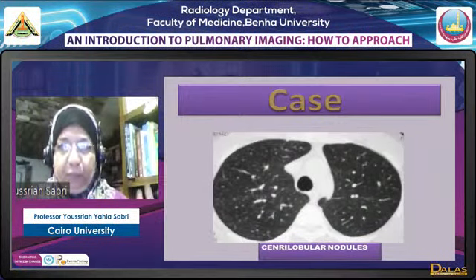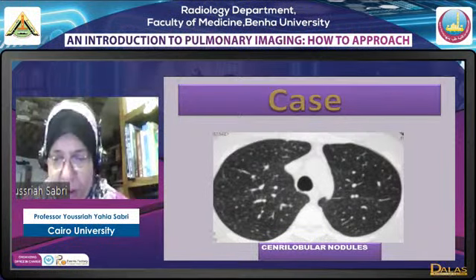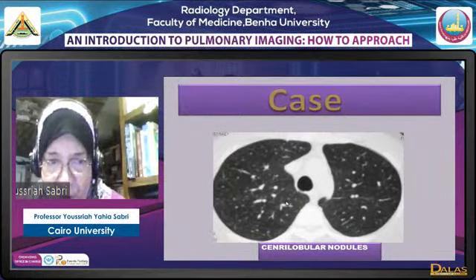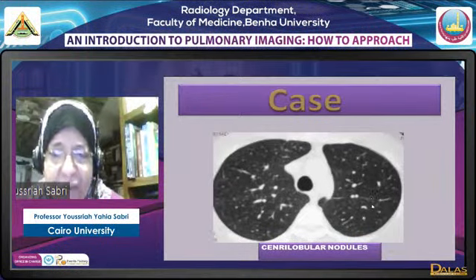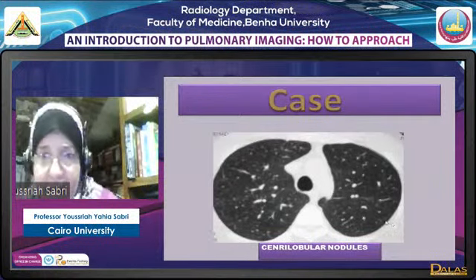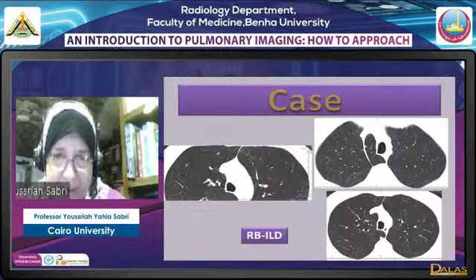Now let's proceed. Let us introduce you to nodules. Now this is a pattern of centrilobular nodules. This is how centrilobular nodules may look, as if we are looking at stars in the sky at night. Another case with centrilobular nodules.